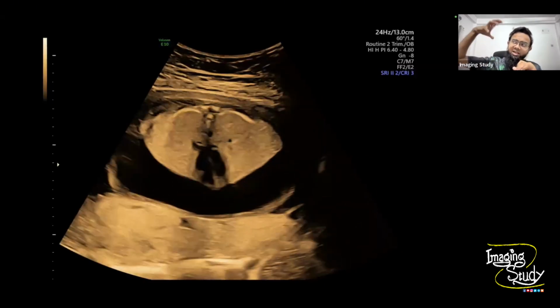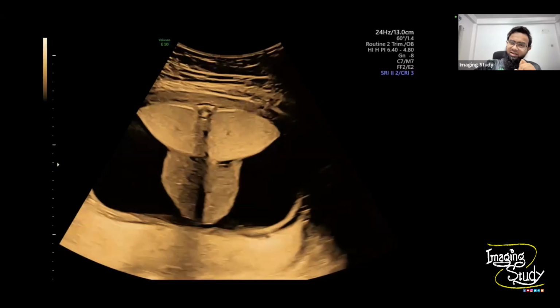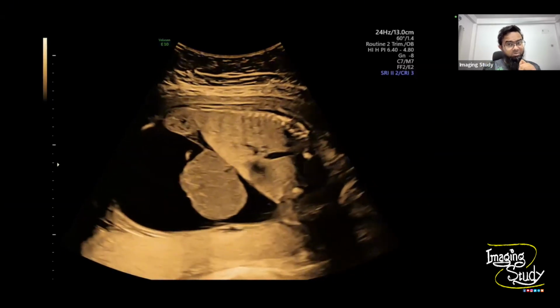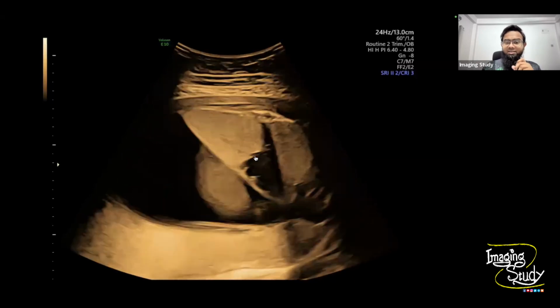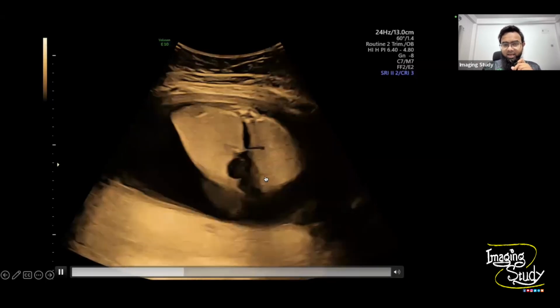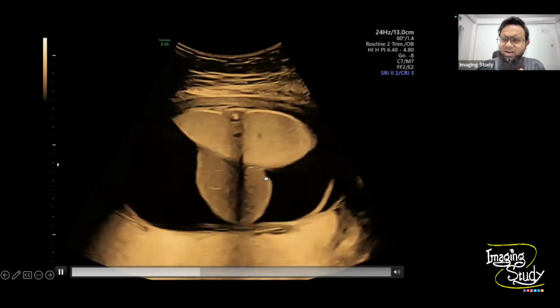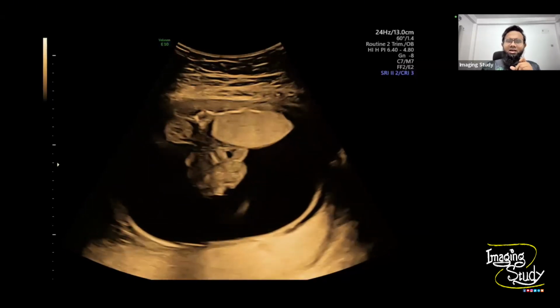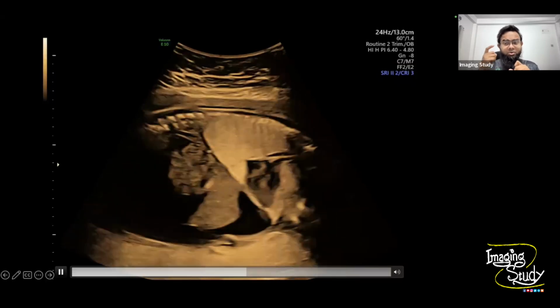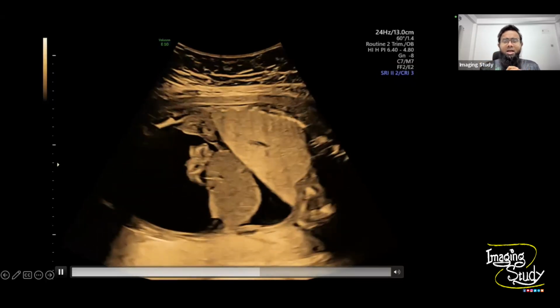So definitely the lung is pressing the diaphragm to get everted, which is not a common finding. And which lung is enlarged? You can see all two lungs are enlarged. And where is the heart actually in this patient? The heart is located at the central part, not at the left or right. It's located at the central part.